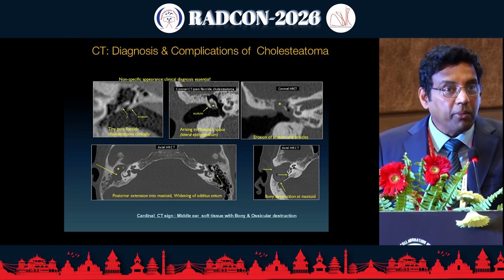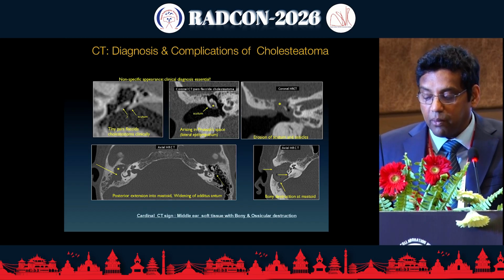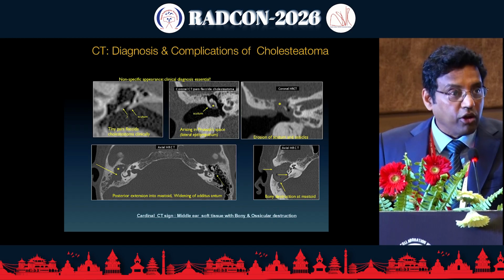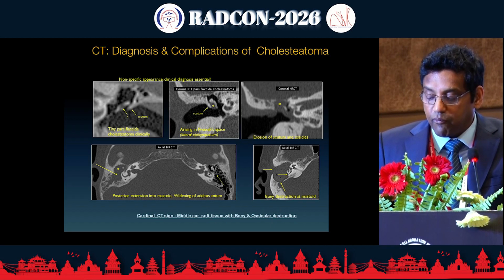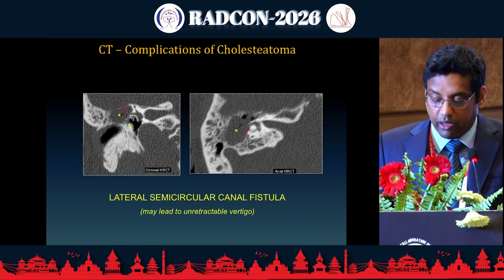But when the cholesteatoma gets bigger, yes, it's very obvious. We know this is cholesteatoma because it erodes the bones and the ossicles. There's blunting of the scutum here, typical epitympanic disease, and it can involve the mesotympanum here. And then if you leave it longer, this is what happens. It erodes all the middle ear cavity. You can see the ossicles almost gone compared to the normal side, where you have the ice cream cone.